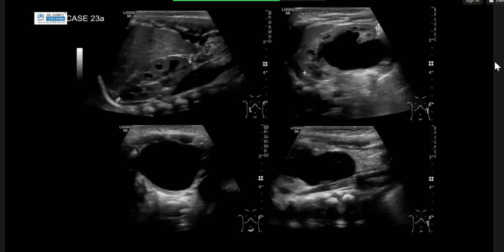So this appears to be a unilateral pelvic ureteric junction obstruction on the left side with thinning of the cortex, PUJ obstruction. Okay. Go on. What would you do as your next step of investigation? For further clarification, we can do a nuclear medicine study. Okay, so what question would you have if you see a PUJ obstruction?